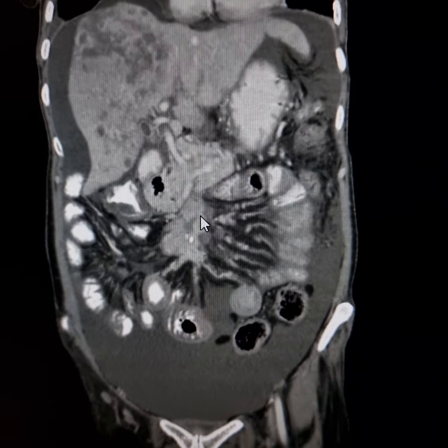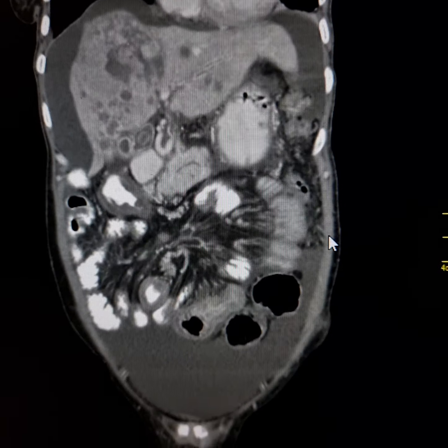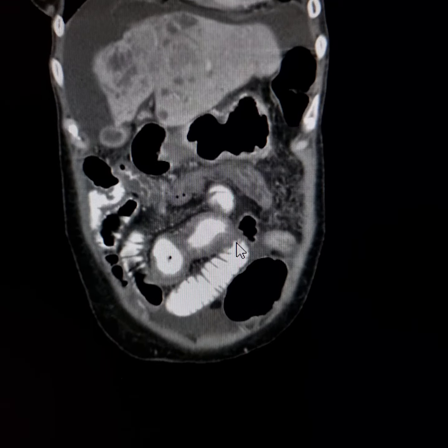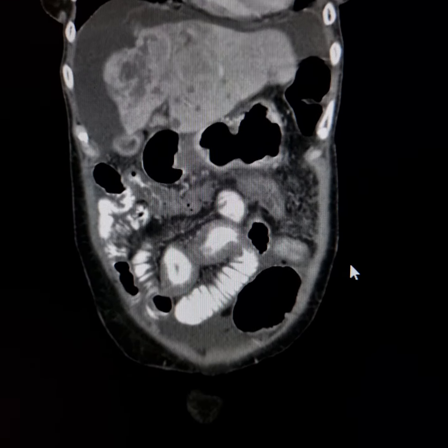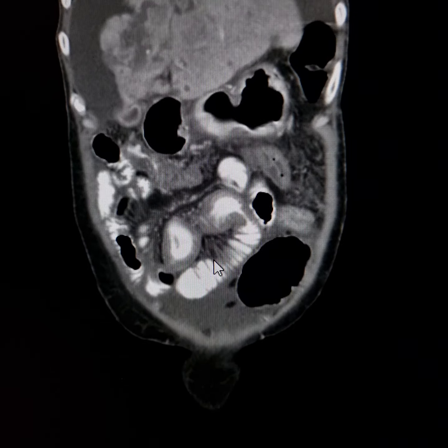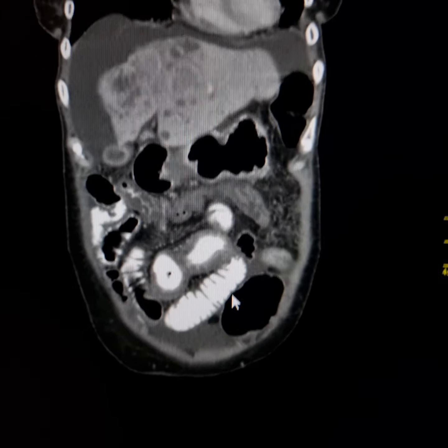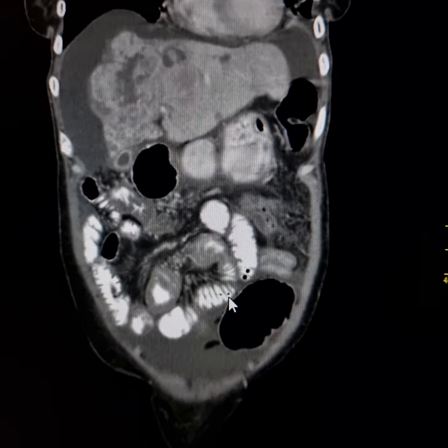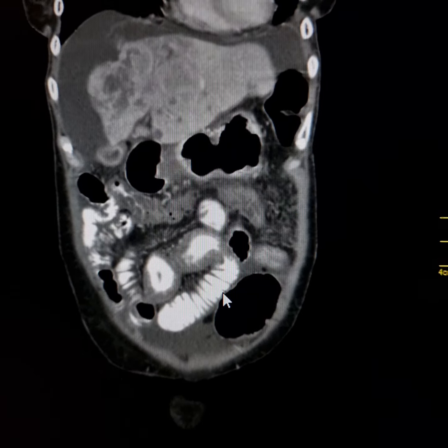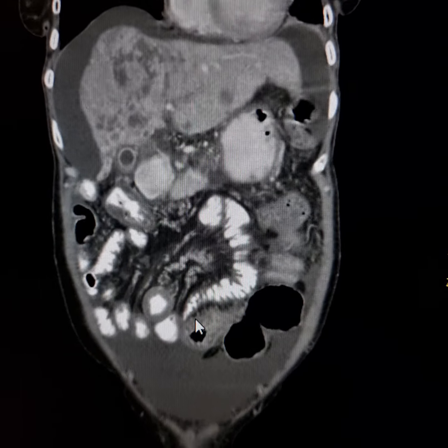Now this is the lymphoid mass here, this one. This has occluded the lumens of the superior mesenteric artery and superior mesenteric vein, resulting in the typical features of small and large intestinal ischemia. Please observe the thickened wall showing non-homogeneous enhancement. The enhancement patterns vary with the degree of ischemia, whether it is acute or gradual onset, and the development of collaterals.